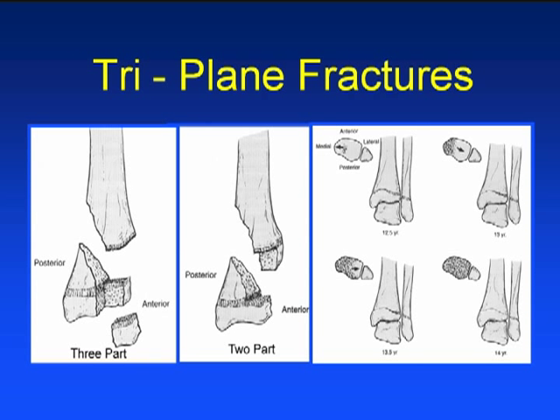But the scar starts here. It goes medially first, and then it fills in laterally. So if you sequentially follow from the upper left to the upper right, you see the medial scar physis has closed off. You then come down and you progressively get scarring toward the lateral aspect of the distal tibia. This sets up a unique situation. In kids, growth plates, particularly as they are amping up their growth to scar off, are the weakest link. In this particular case, you have a bone that is differentially weakened by growth plate activation.